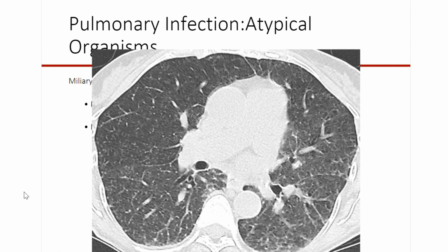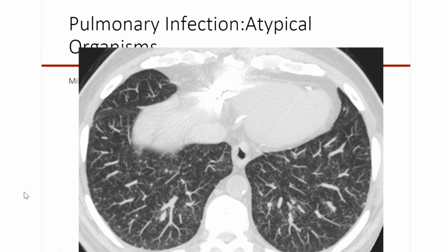So besides tuberculosis, miliary nodules can be very hard to see, even on CT. Sometimes we're using MIPs, maximum intensity projection images, to really find our miliary nodules. And this one, the quants were negative, but they threw antifungals on it anyway, and it resolved. So we don't know what fungus this was. But this one, you can see using our MIP images, multiple miliary nodules.